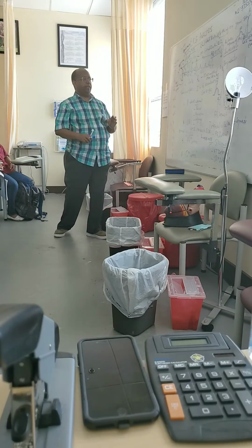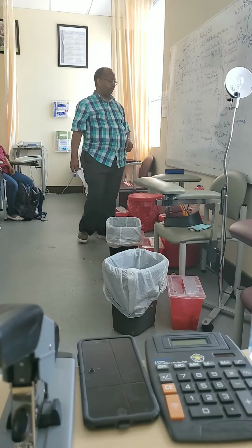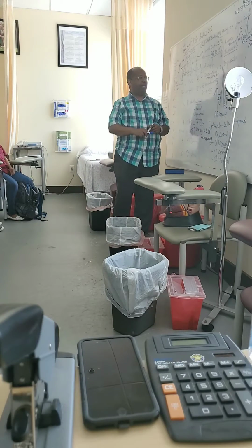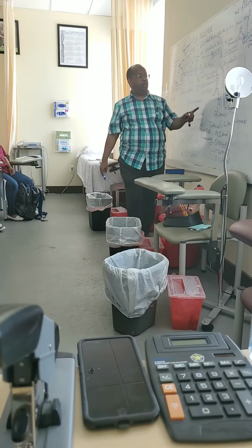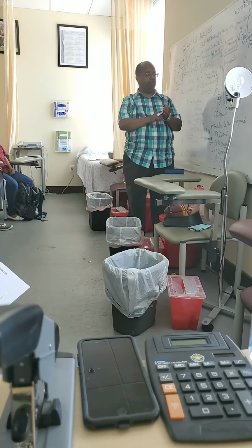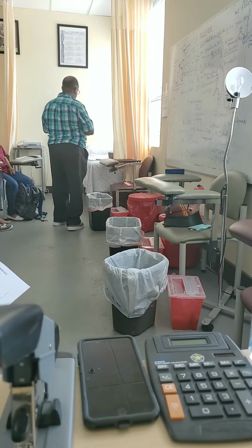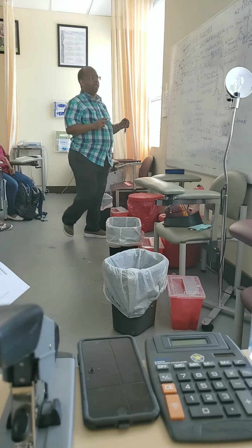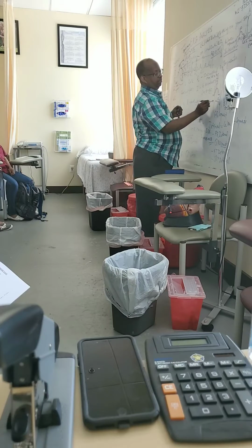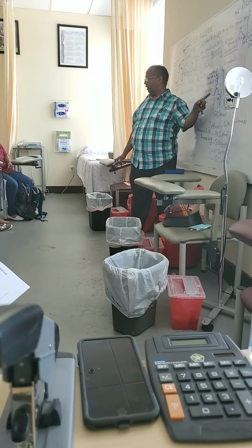Okay, that is called QRS, between this and this. Then we have the PR interval. PR interval means, you know, from the beginning of P to what? The beginning of Q. Okay, this gap is the PR interval. So from the beginning of P to the beginning of Q.